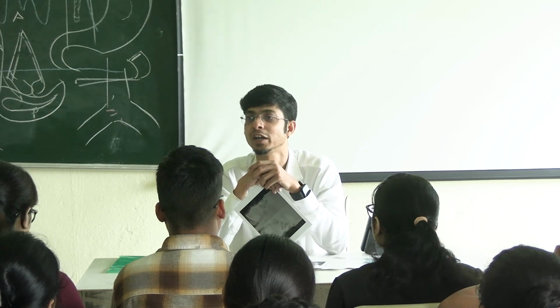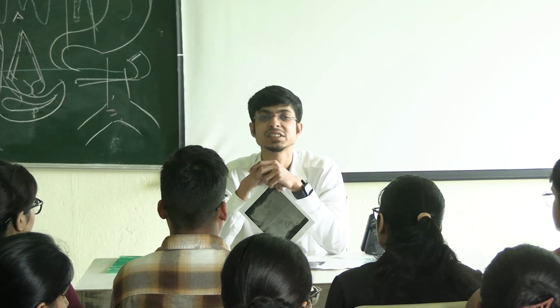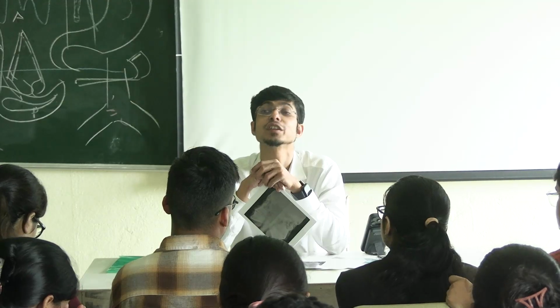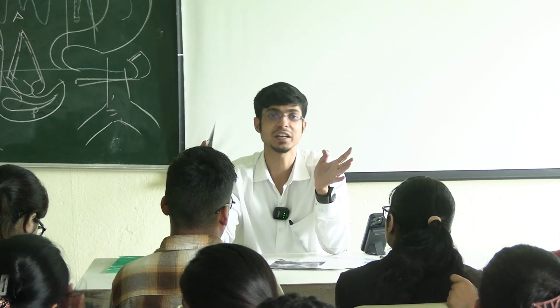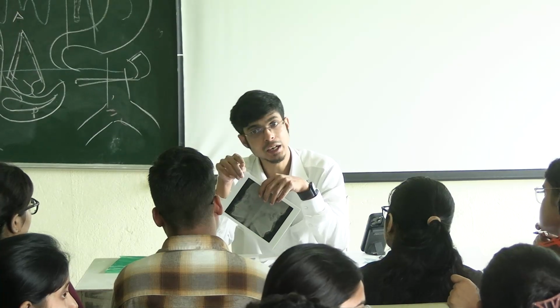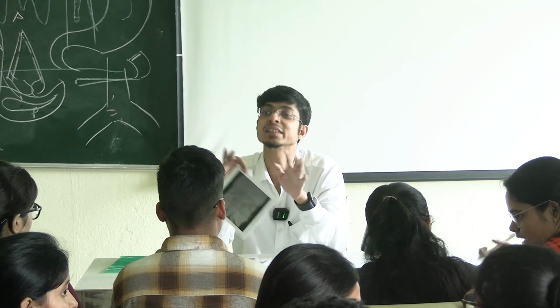Then you see the cardiac shadow. কি হতে পারে? So the size of the cardiac shadow, the shape of the cardiac shadow, the aortic knuckle. আমি তো আর পালমোলজির লোক নই, মেডিসিনের লোক নই, but these are the basics everyone should know.